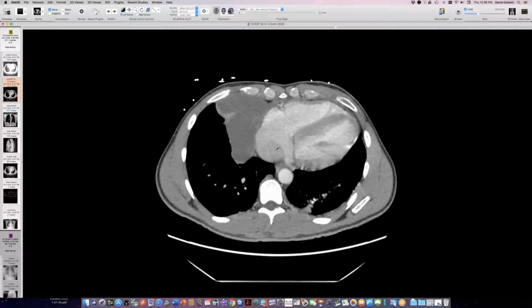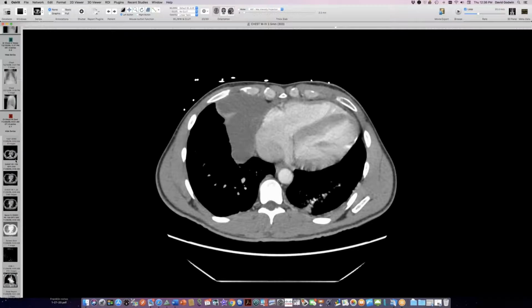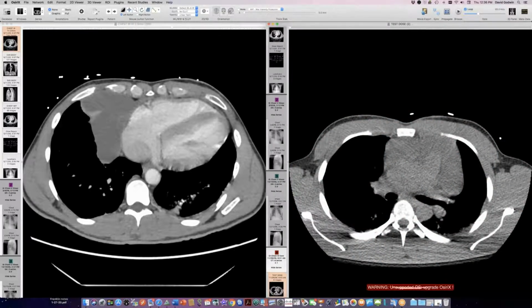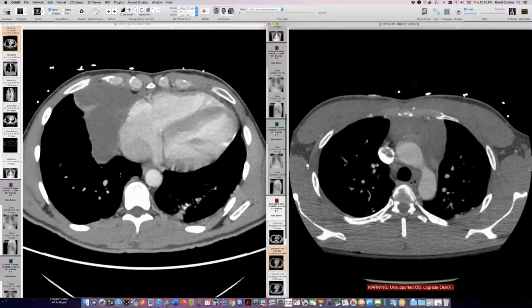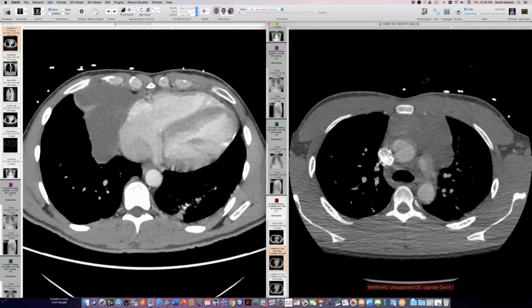David, can you show the first CT? Because I wondered whether in a couple of places it wasn't completely cystic, whether there was any tissue, vessels in its anterior portion on one of the CTs that you showed. Yeah, this is the earlier CT, and it does have some inhomogeneity to it.